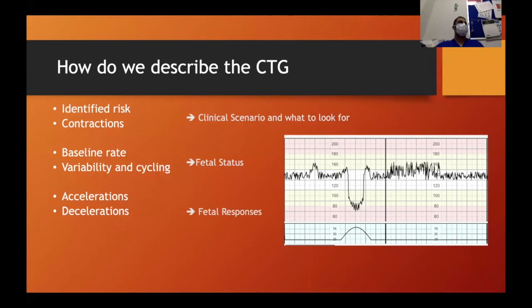Which one do I like seeing more on the trace? If you are to choose a response on the trace, which one would you select?